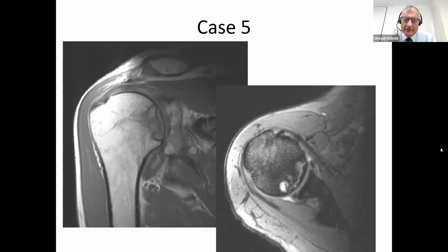Yeah, avascular necrosis. So what we've got is an abnormal signal in the subarticular bone of the humeral head. And on the T2 weighted image, you can see a sliver of fluid and then a much darker bone compared to the rest of the bone, which is superficial to that sliver of fluid. So this bone has died. There isn't a normal blood supply, and it has fractured, and a little bit of bone is hanging by a thread, perhaps, and fluid has seeped underneath it.